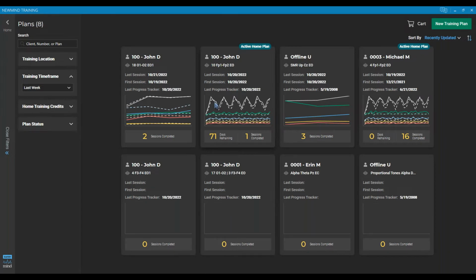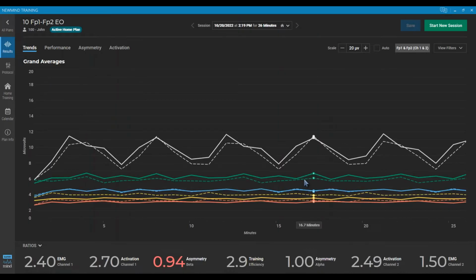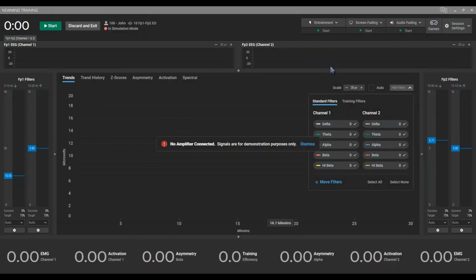All right, so one of the things Dr. Suter asked that I talk about was just our Photic menu. Since he just did a presentation on Photic the other day, he wanted to make sure everyone understood how to use that menu and all the different things that are in there. So we'll start a session up here so we can see all of our controls.